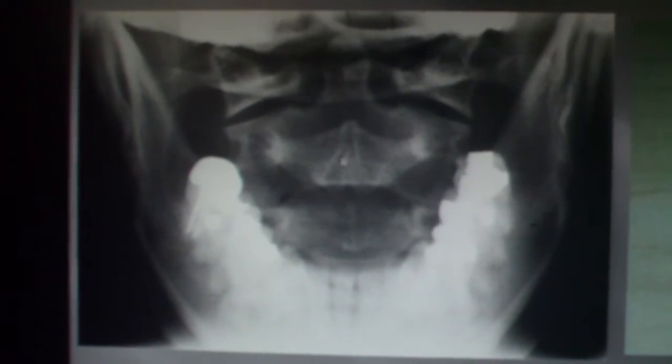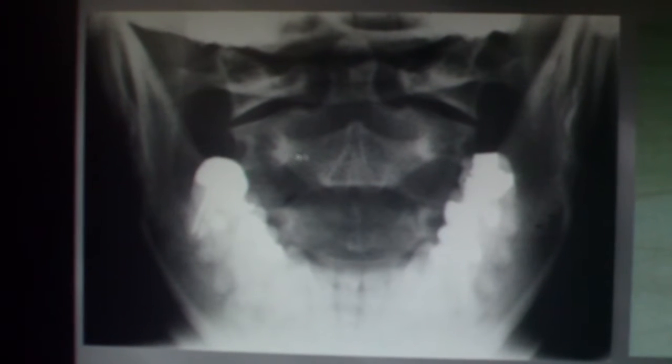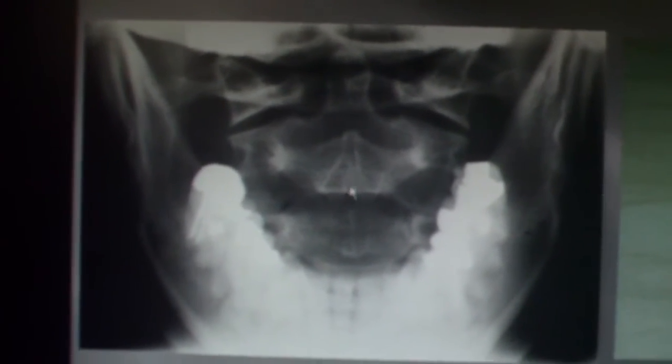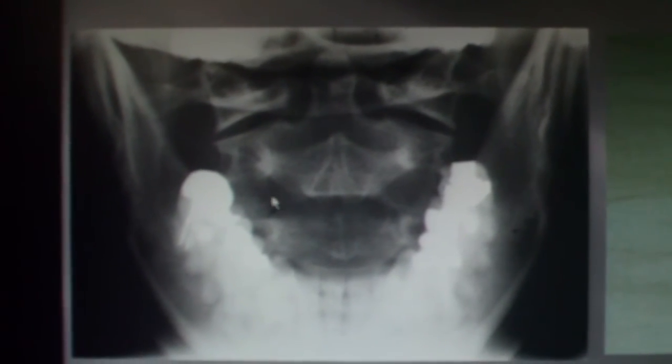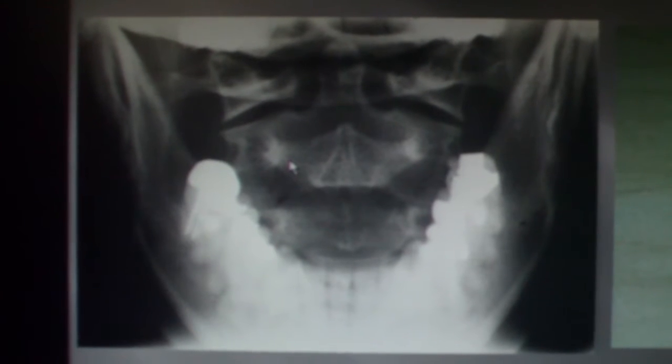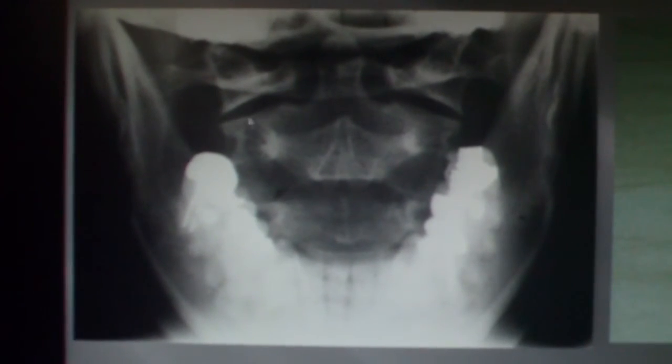This is the lamina here between the pedicle and the spinous process, then spinolaminar junction and spinous. And again, the inferior articular process comes off of the lamina of C2, whereas the superior articular process is adherent to the body of C2.